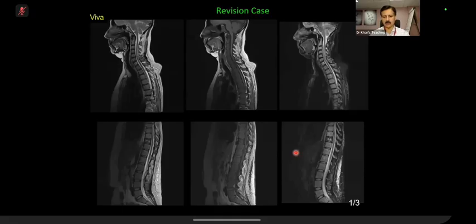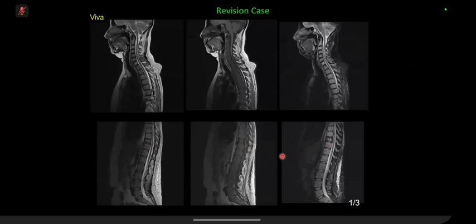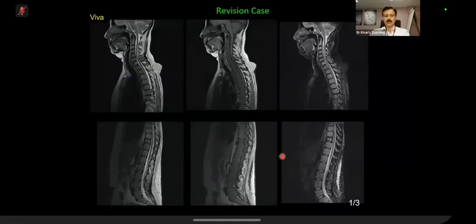Over to you. So in the T2 weighted image in the bottom left, there is abnormal signal within one of the thoracic vertebral bodies. So I am not interested. This was a known fracture. I know it. Okay. Look at the marrow. Hint.